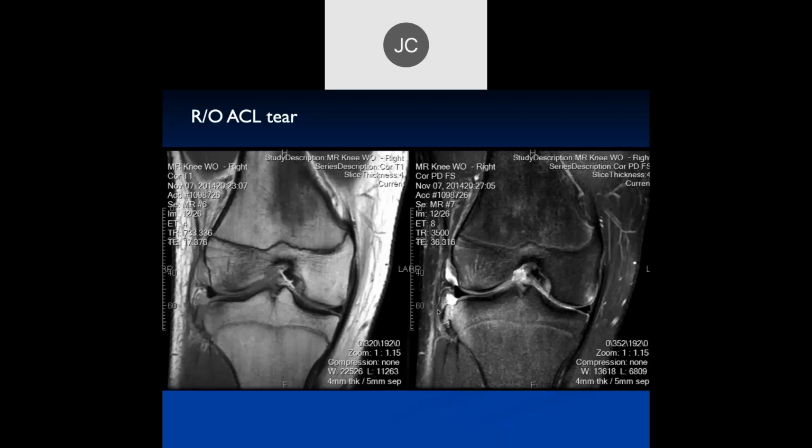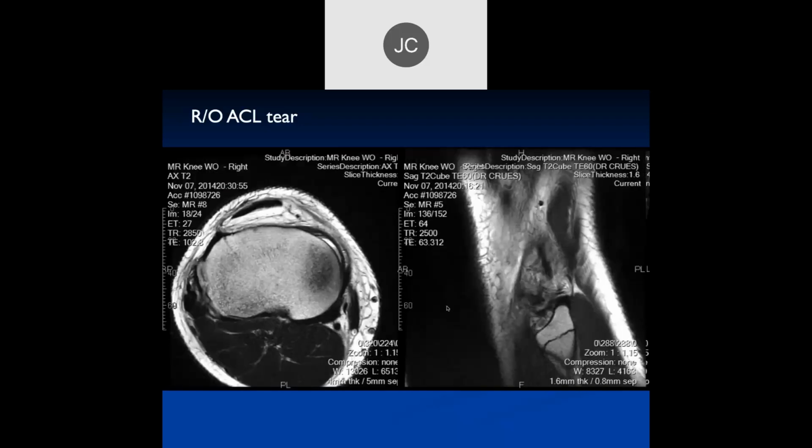And what's happened here? Oh, bony avulsion of that. Yeah, so this is another Segond fracture. This is what it looks like on an MR examination. Here we can see that Segond fracture over here. And here we can see the lateral collateral ligament. Here's that anterolateral band coming down, and that's where the fracture is on the sagittal images.